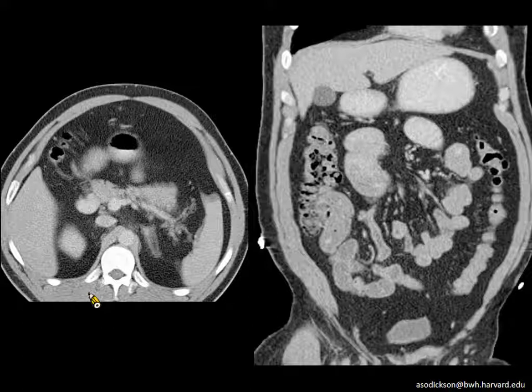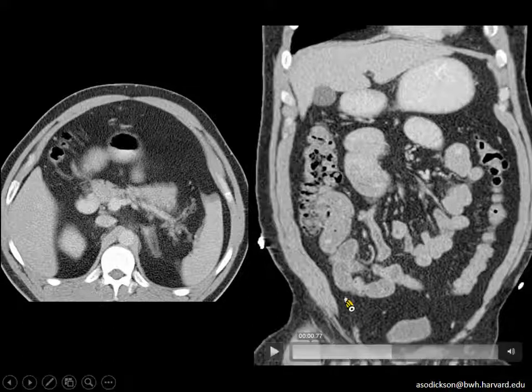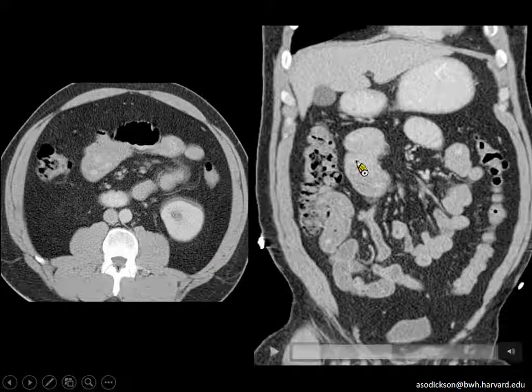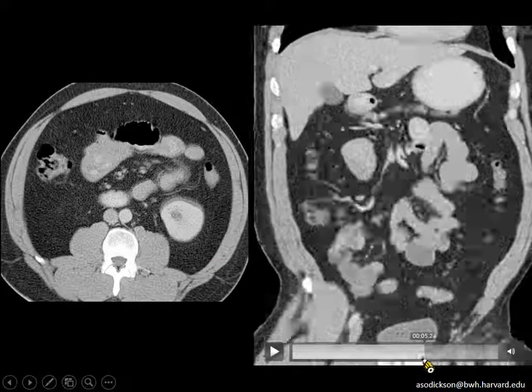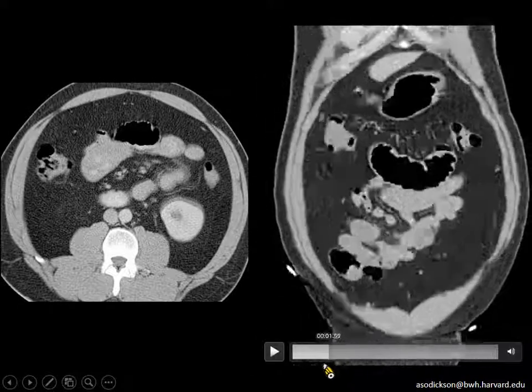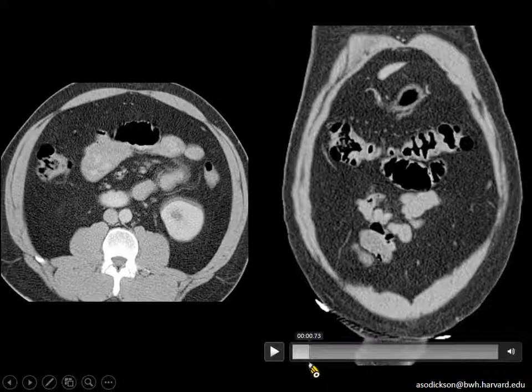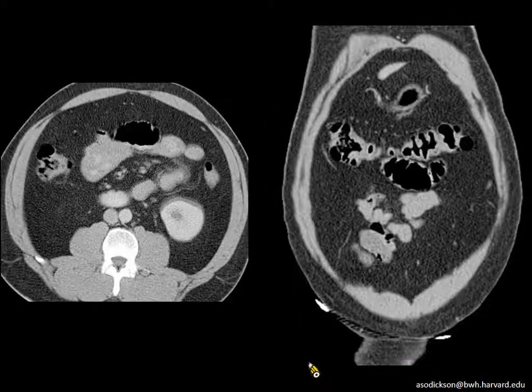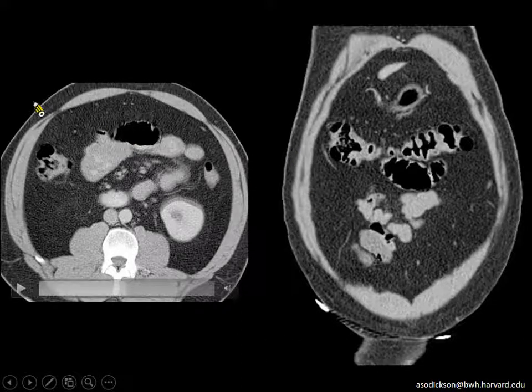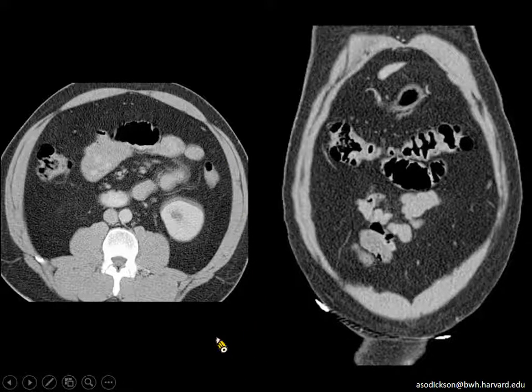And so you're seeing it distend the duodenum and the proximal jejunum, and as we run out of our oral contrast bolus, the caliber of the small bowel decreases. So this, I think, is purely an artifact from the patient swallowing a large volume of contrast. But unfortunately, this was called a small bowel obstruction. This case was from some time ago, before our oral contrast challenge algorithm.